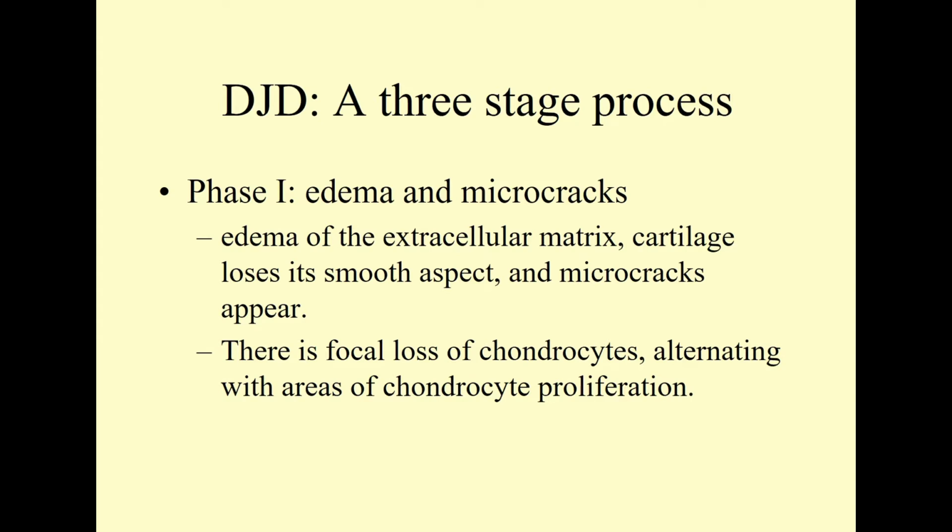The edema component, some of this relates to what we just talked about in the previous section, the Modic changes. We know that in subchondral bone early on we'll start seeing infiltration of edema into the marrow, producing an uptick in signal intensity on T2-weighted images. Now, these studies were arrived at independently, but it's nice when different focuses of research join together and support each other, in this case, by accident. Along with this microcrack, we start seeing edema in the extracellular matrix. Cartilage will lose its smoothness. Now imagine, remember, it's supposed to be slippery, it's supposed to be smooth, it's supposed to be cushioning. Well, these things will compromise those prime functions.